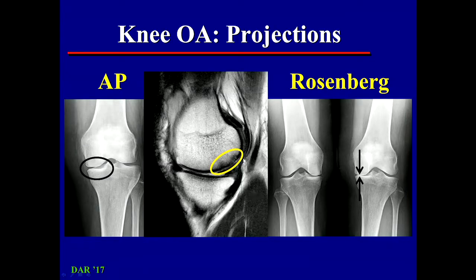So on this knee MRI, this is where we've lost all our cartilage. When the patient is standing, what we're looking at is the cartilage that's still there. This black and gray stuff here is the cartilage that's giving us the joint space that looks normal. When the patient flexes their knee and then weight bears, this part of the bone moves here. And so now what we're seeing is less cartilage against that surface and more joint space narrowing.